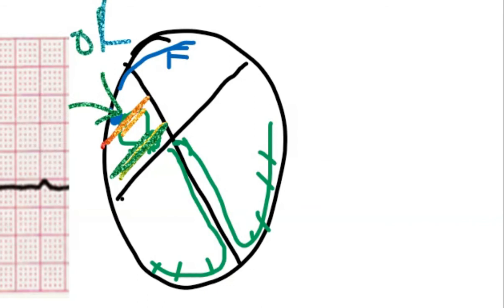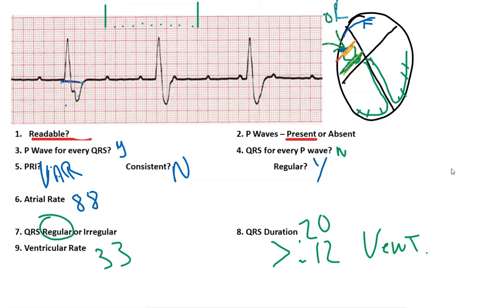And this is when we actually take a look now at that QRS complex. So if we look at this QRS complex, when we say that we're looking at the width of this QRS, if it is coming from the ventricles, so here we saw that this had a QRS duration of greater than 0.12, that tells us that the ventricles are actually being the backup pacemaker. We know this because the impulse coming from the SA node probably traveled down to the AV node, and the AV node processed it. However, the block is occurring in a brief area right after the AV node. Therefore, the ventricles never received the impulse. That's why they're the backup.